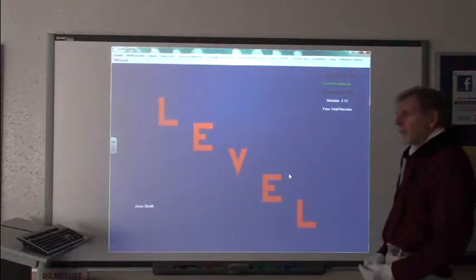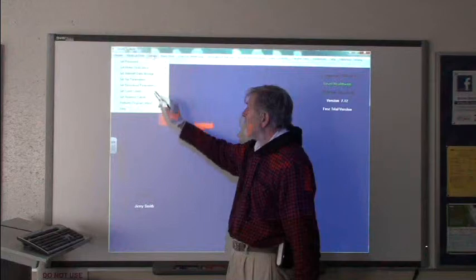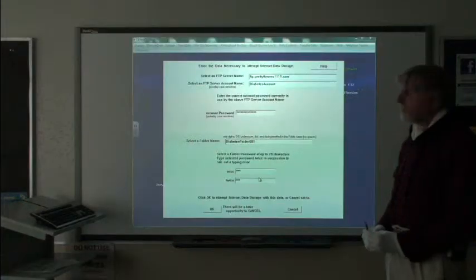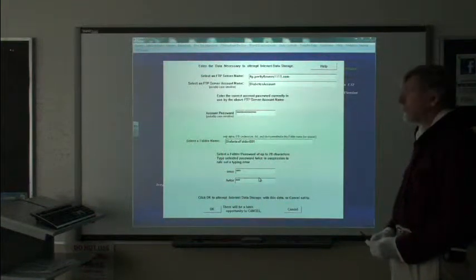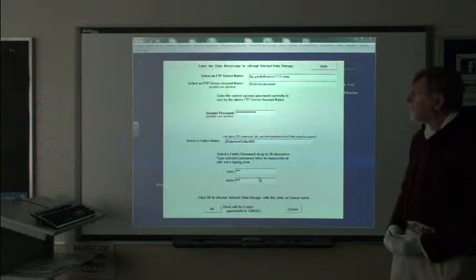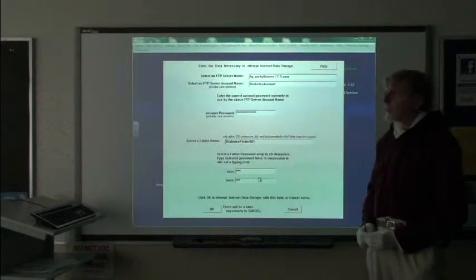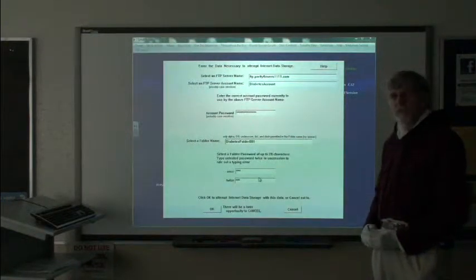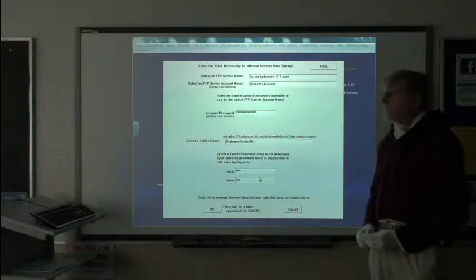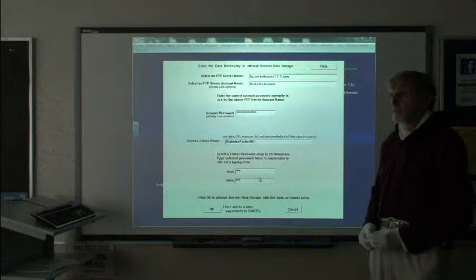So now, let's connect to the Yahoo Small Business location. We go to Setups, Set Internet Data Storage, Use, Don't Use, say yes. It appears with the same parameters with which we left it the last time. It remembers them. The most likely scenario for your having detached from internet data storage for some time was that you got bothered by the 30-second sign-in and sign-out times, so you wanted to work offline for a while, maybe some number of weeks.